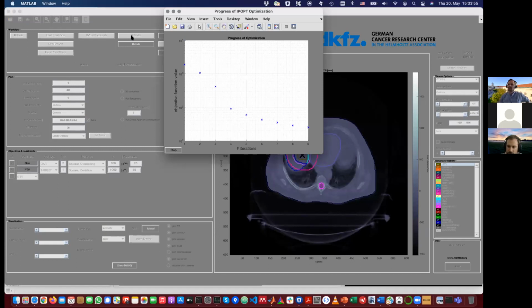Niklas and I also decided to use this liver case and not the prostate case, because the prostate case is one of the most demanding cases. It's large, and maybe you also saw it when we used the proton setup with the 2 beams. If you go to carbon ions, then because of the additional influence matrices, your memory requirement triples. The prostate is too deep in the patient, so you have large ranges and your matrices get bigger. The target volume is quite big, so everything gets bigger. So taking 1 beam on the liver patient hopefully works for you all.